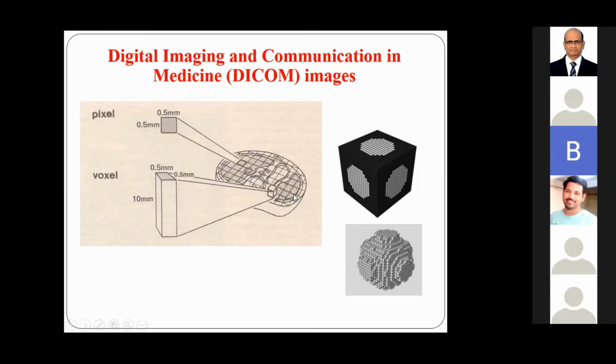Here we are going to develop a 2.5D image. So what is a 2.5D image? It is having the X and Y with uniform Z thickness. That is called 2.5D. If the Z is varying, then we can say it is a 3D. But here the Z is uniform, so that's why we are considering it as 2.5D information.